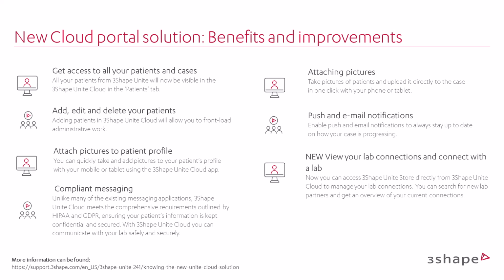Attachment of pictures: easily attach pictures to patient profiles using the 3Shape Unite Cloud mobile application. You can also take pictures with your mobile or tablet and upload them directly to the case with just one click. Push email notifications: stay updated on case progress by enabling push and email notifications. Lab connection management: gain a new view of your lab connections and connect with labs seamlessly. Access the 3Shape Unite store directly from the cloud to manage lab connections, search for new lab partners, and review current connections.